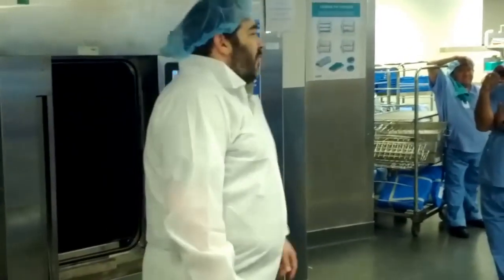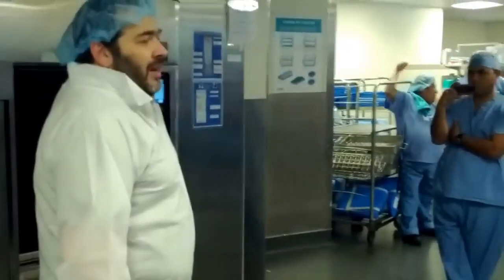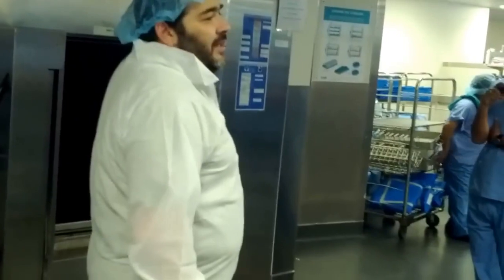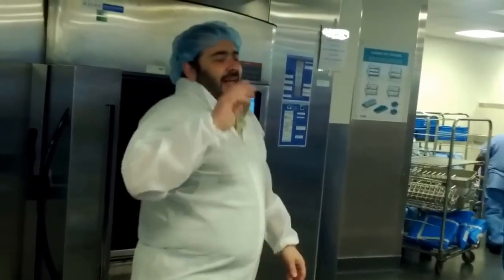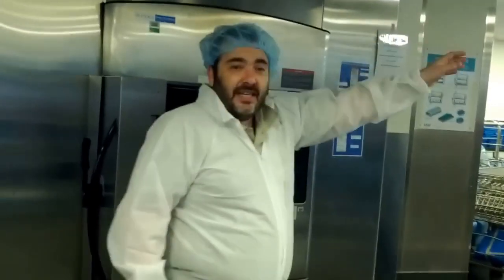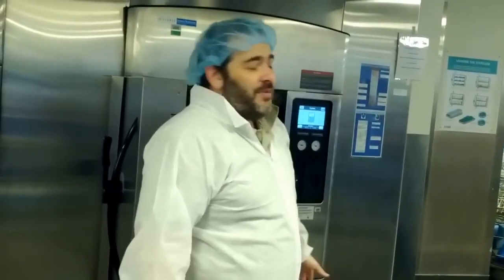And down on the floor, probably won't be able to see with the camera, down in front over here we have a drain. The drain has to be cleaned daily. Otherwise, if the drain is clogged, you cannot remove condensation from steam. And if you can't drain the water out of the chamber, you produce wet packages. Wet packages equal unsterile, and the entire sterilization process has to begin in the decontamination area. Can't just stick it back inside and run the sterilization cycle. It has to start from the very beginning.